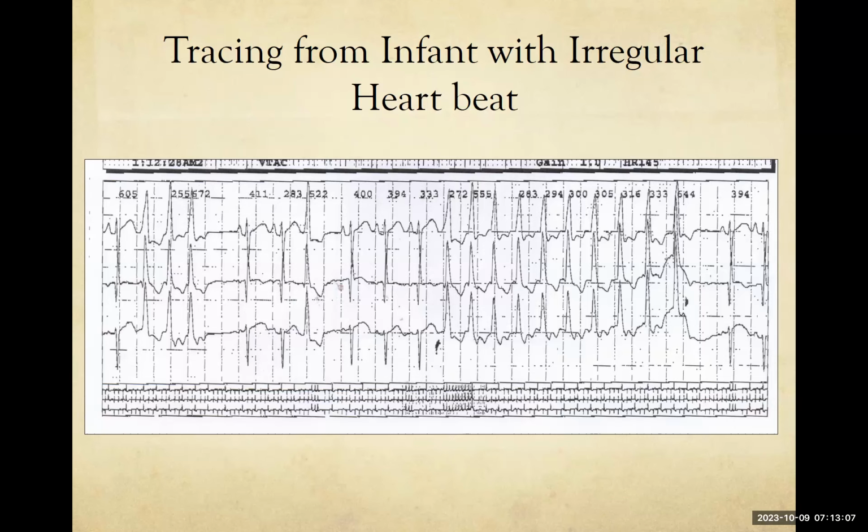All right, so it looks like we have what looks like a sinus rhythm, but then with a bunch of beats of what looks like VT. It looks like there's a triplet, maybe a PVC, and then a longer run afterwards. Mm-hmm. And you're saying this was in the well baby nursery? Well, the rhythm was heard in the well baby nursery, but this was recorded in the NICU after the baby was transferred. Right. So I agree. This is some kind of VT.